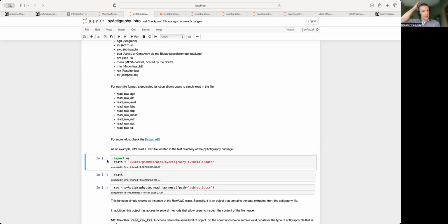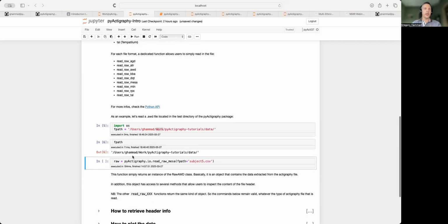Okay, so let's now create a small string, which is just the path to the file that I downloaded for this workshop. Here you can just modify the different paths and adapt it to the path where you store the actual data for this workshop. Here I put them into these subdirectories under data. You can inspect. This is exactly what it is.